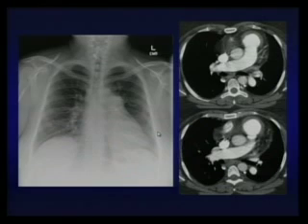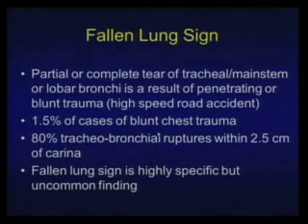In this particular case, we have prominent pulmonary arteries with convergence sign. There is a convergence of the pulmonary arteries. In this particular patient with pulmonary arterial hypertension, there is enlargement of the main pulmonary artery and enlargement of the right and left pulmonary arteries.